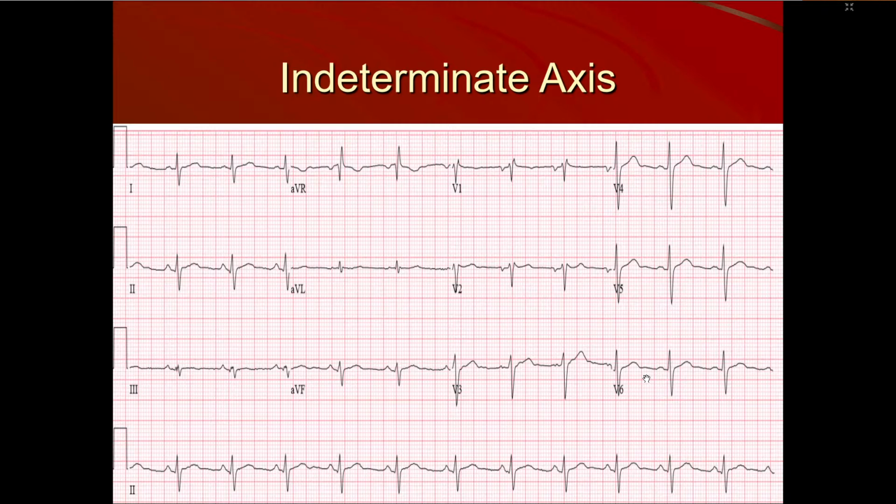So what you should do when you interpret the ECG is look at the calibration, then go complex wise. You see the P wave, SA node, P wave, atrium, what all things can happen at atrial level, then the AV node, then the bundle branches and the ventricles. So you divide and look for the things in that particular area which can cause that finding.